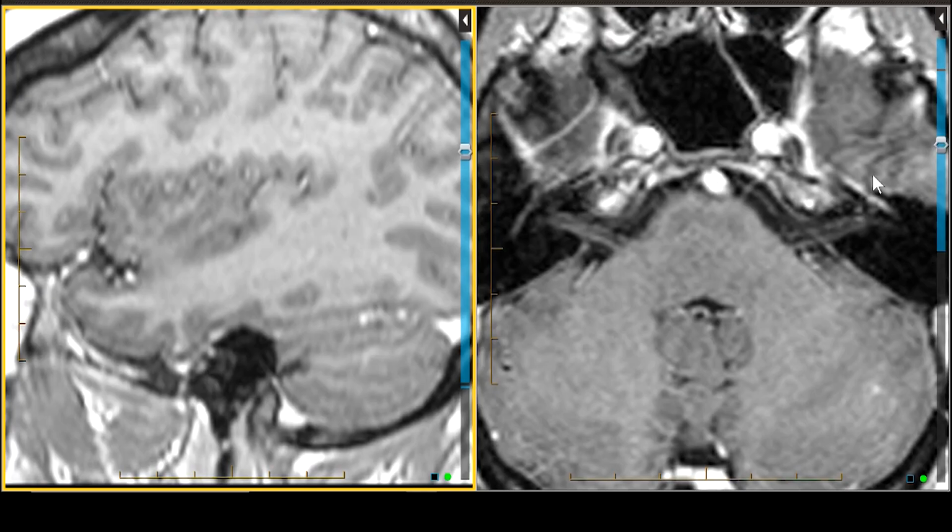Now, my sagittal T1 is taken all the way out here. And these two dots right here represent the seventh nerve, up, cochlear nerve, down. I'm going to ignore the cochlear nerve right now, and we're right at the locus of the geniculate ganglion. So we're right over here in the axial projection.